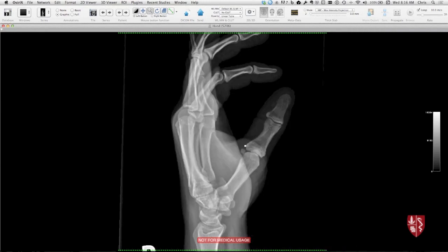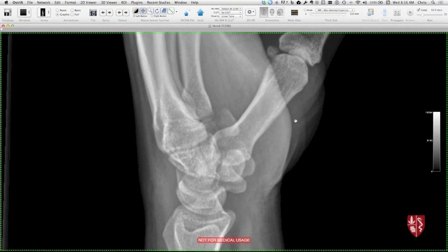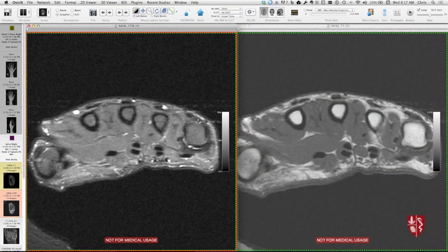So if I go to the lateral view here and zoom in, lunate, capitate, see the scaphoid in here, pisiform. And so this is the hook of the hamate sticking out like this, right? And what Dr. Stevens astutely picked up is there's a lucency across the hamate hook right here. So those can be very difficult to detect. They may just be radiographically occult, but it's another situation where if you are suspecting something and you don't see it, you can do either a CT scan or you can do an MR scan. And this patient happened to have had an outside MRI scan. So it's a nice example of a hook of hamate fracture.